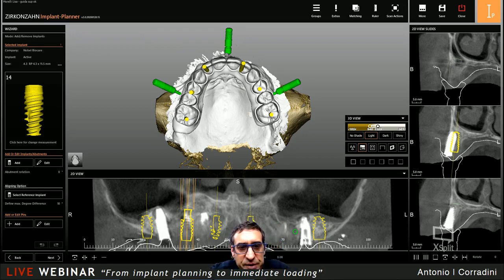Here, once we load the implant, we have a look at the setup, and you can see for sure I was lucky in the previous modifier step when I was loading the anatomies, because the position is, let's say, fine. I have not to adjust anything about the setup. You can see that the holes are coming out in a good position, let's say occlusally or palatinal in the frontal view.